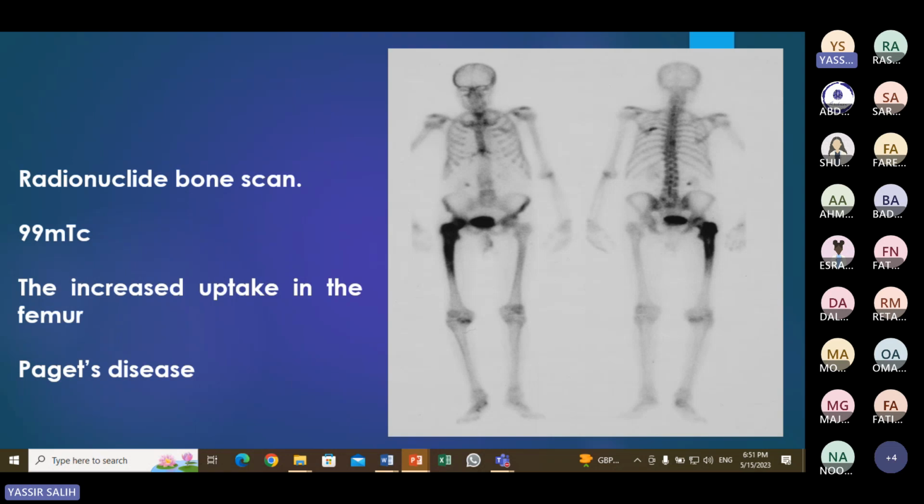This slide gives the name of the imaging modality. Nuclear medicine. Radionuclide, or radionuclide or nuclear scintigraphy. And the imaging examination is what? Imaging examination instead of modality.